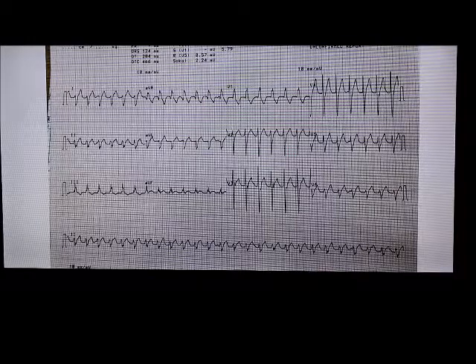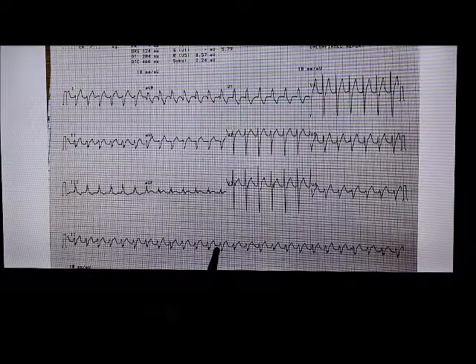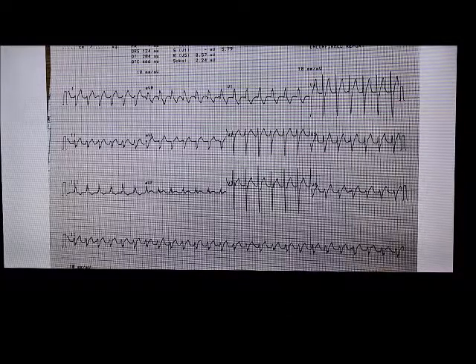This is a P wave here, part of it, and clearly here this is a P wave, and there's another one here. Once before the QRS clearly, once slightly inside the QRS, once more inside it. So this is AV dissociation, so this is VT actually. AV dissociation 100% tells you it's VT, and AVR is positive, so that will also help you.